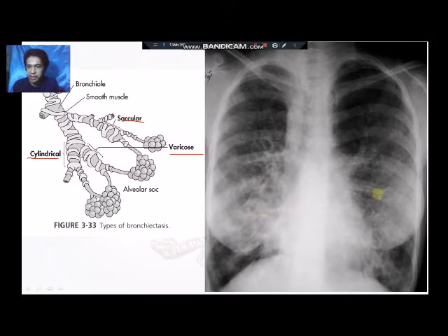So munang mag-increase po sa ilahang appearance, so mag-increase sa ilang opacity. Okay, so mura sila mga patchy nga mga appearance gihapon siya. But then if as you can observe, no, ang iyahang patching appearance or white nga mga appearance is naadri dool sa hilum sa ato ang patient siya. Okay, so the hilum or the hilar region is the entrance of our bronchus padulong dira sa ato ang lung fields. Okay, so since naman dira itong mga bronchus, and then it's the bronchus that are dilating, so munang naapod diri dapit nga portion and ga increase sa iyahang whitish nga appearance.